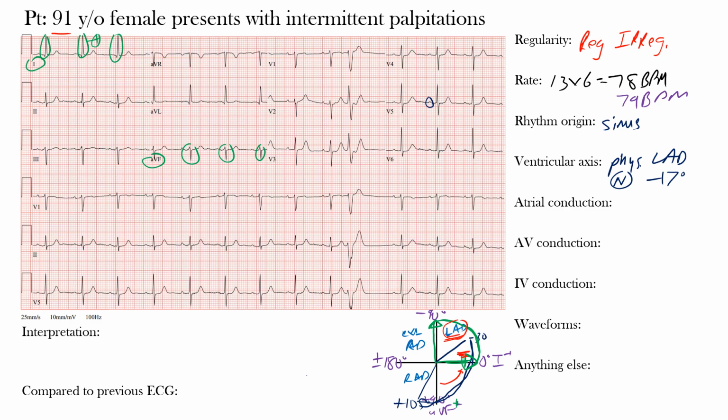Well, what we have to do is now look at another lead, and that's lead 2. Now lead 2 comes down here. This is lead 2, and it sits at 60 degrees. And what's important about lead 2 is that because it's at 60 degrees, if we take the perpendicular to it, it actually goes right along this, which is that negative 30 degrees.